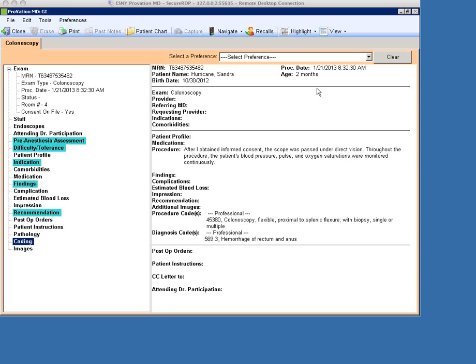Over the last 6 months, after our preliminary analysis of the data, we have found that there are certain documentation errors that are being made in the system, despite the physicians in general all doing the appropriate work. I wanted to spend the next 10 minutes briefly reviewing a sample examination and the appropriate way of documenting the procedure so that all of our members, when the data is extracted, can have reports which accurately reflect the work that they are doing.